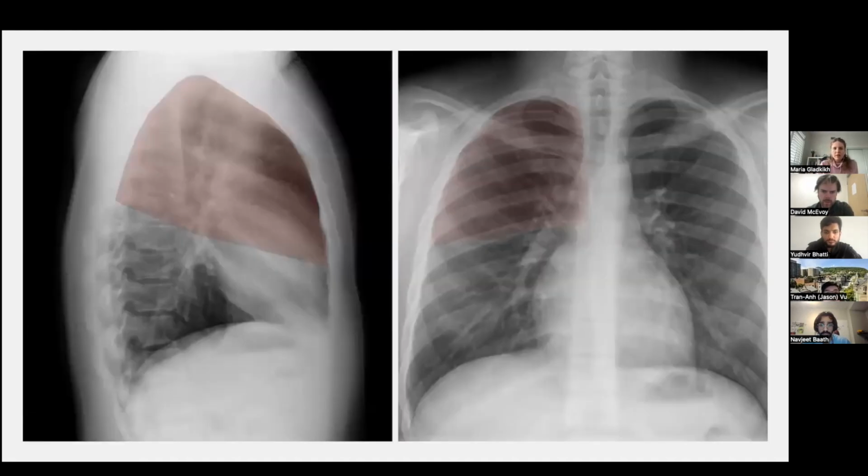Okay. So when we talk about locations of lesions, we know that the right lung has the right upper, right middle, right lower lobe, and the left lung has the left upper, lingula, left lower. And to be completely honest, you can't localize a lesion based on a frontal radiograph alone, with some exceptions, and I'll go through that. Even then, you should question yourself. But if we think about the anatomy of the lungs, the right lower lobe extends all the way up, right? If you remember the 3D anatomy, and let me actually share this with you.